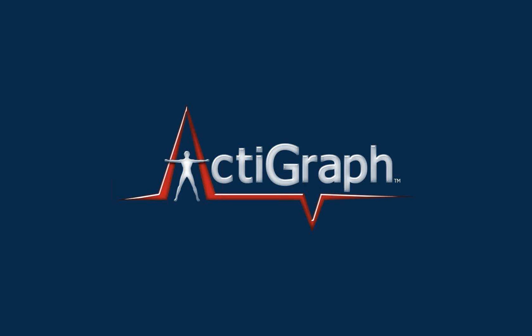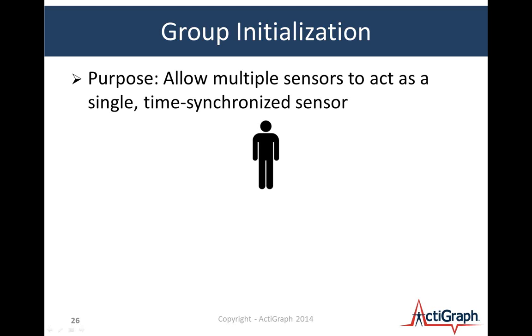Let me jump back. I want to talk briefly about group initialization. This is another feature in ActiLife. It's not too unlike the proximity tagging initialization, but the purpose is a little different. The purpose of group initialization is to allow multiple sensors to act as a single time-synchronized sensor. And so the use case that we envision here is that some of our clients are placing multiple devices on a single subject and looking at pattern recognition or fuzzy logic to determine what type of activities they were doing.